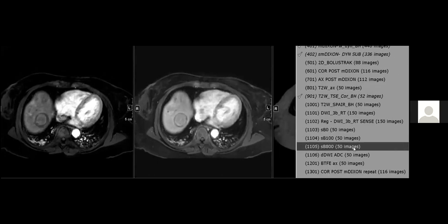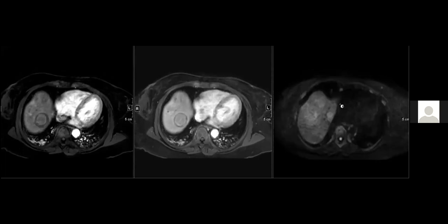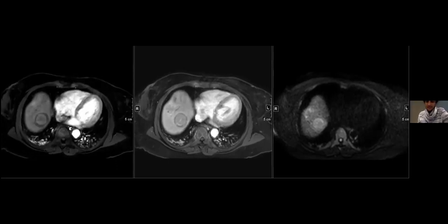Based on this one lesion, which in the interpreting radiologist's opinion looked like a target, they said, well, you have multiple masses in this patient. At least one of them has targetoid features, which is LR-M. And if you read LI-RADS, you know that one LR-M feature is enough to categorize something LR-M. So that's what they said. They said metastases. Steve, is not the right targetoid look? Correct.